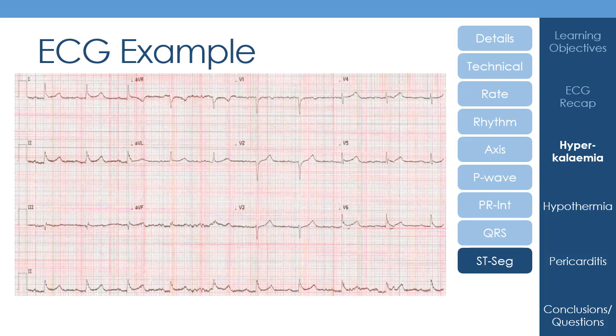So ST segments, I think, broadly look all right. I think the person who was initially looking at this ECG has obviously highlighted the ST segments in V6.